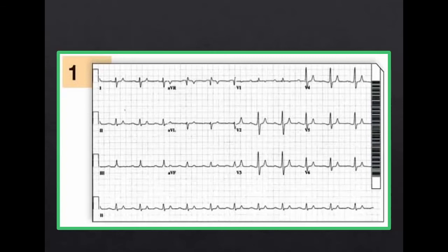What do you think about the T waves? Do you think the waves are looking a bit pointy? Yeah, excellent. That's why I always have PTSD from school. What they used to do to me, they used to bully me. They used to put drawing pins underneath where I used to sit. So if you think about a drawing pin T wave there, yeah, in any case.